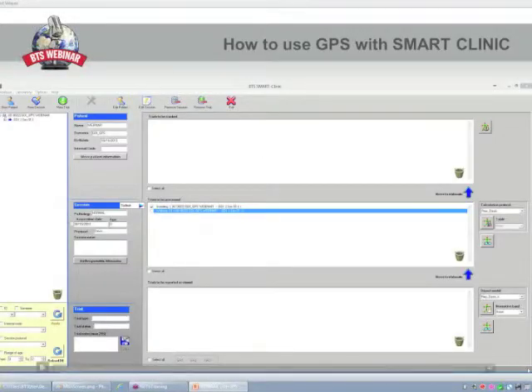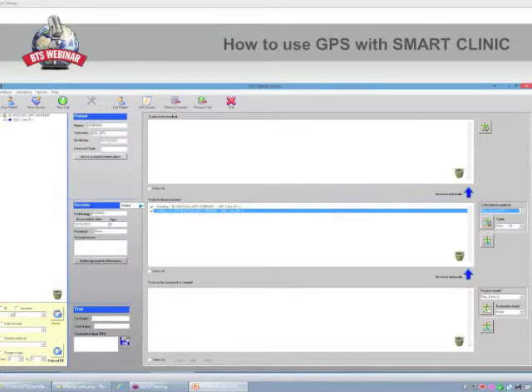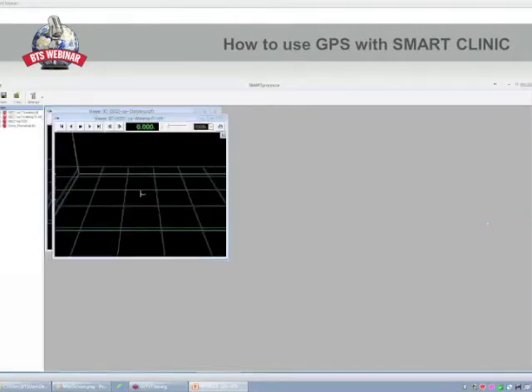Now let's have a look at how to run the GPS. So it's almost the same. You have to consider one standing and one walking. You just have to select in SMART Clinic the protocol which includes the computation of the GPS in this case, and you have to select the table which contains the normative bands.